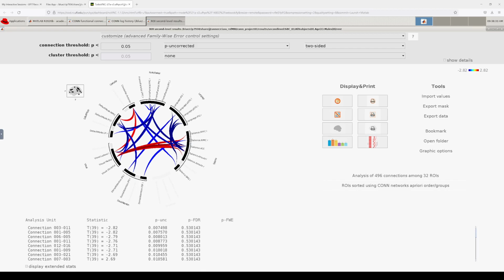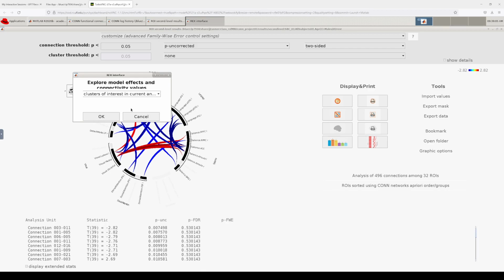That this can actually be, if we notice, these are between networks, and we can have a strengthening of this negative correlation between networks, so they can, in effect, with more age, maybe become more anti-correlated. They could be getting weaker. You have to look at the effect size. We won't go into that, that's more advanced, but interpreting direction of this, what these mean, takes some time. You have to look at values, and there are ways to do that.